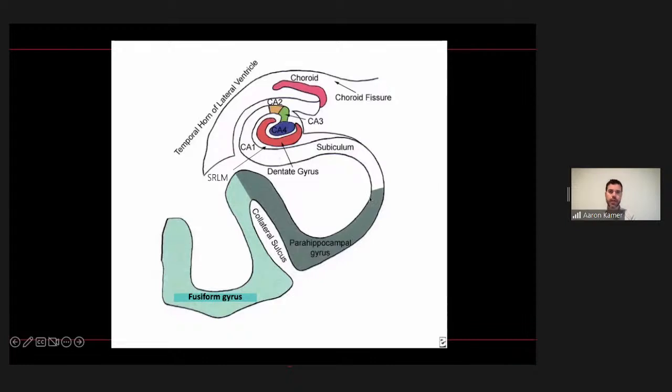Like I said, this is parahippocampal gyrus, and there are definitely anatomic components of the hippocampus that we can name even more specifically if we see lesions in any of these specific areas. You'll have a little bit of choroid plexus that's very common to see above the hippocampus. Don't get confused by enhancing choroid plexus, thinking that it's some sort of pathologic lesion. I've seen that happen many times. And then this is the choroid fissure containing CSF, and the temporal horn also containing CSF and wrapping around the hippocampus. So if you see a lesion in a specific part of the hippocampus on cross-sectional imaging, you can certainly talk about it.